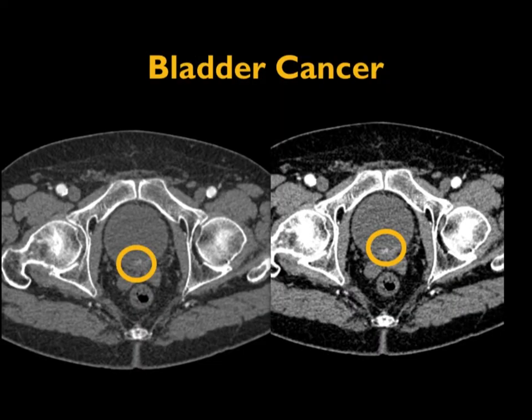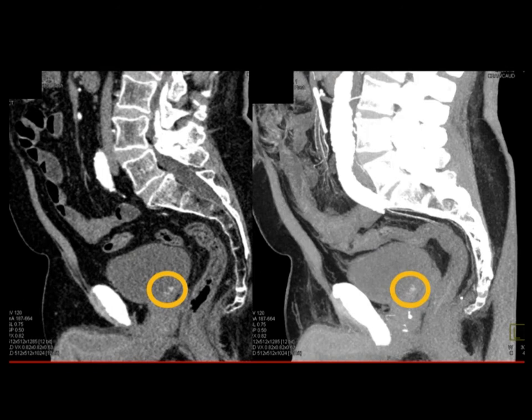Now, both of those cases had large bladder lesions, nothing you're going to worry about. But what about a case like this? Look at this subtle lesion in the posterior bladder wall. Or maybe it's just contrast that we injected, layering out. If you look at that image carefully and you go to the sagittal view, you see it very nicely. And that's going to be a small transitional cell carcinoma, very nicely seen on the images.